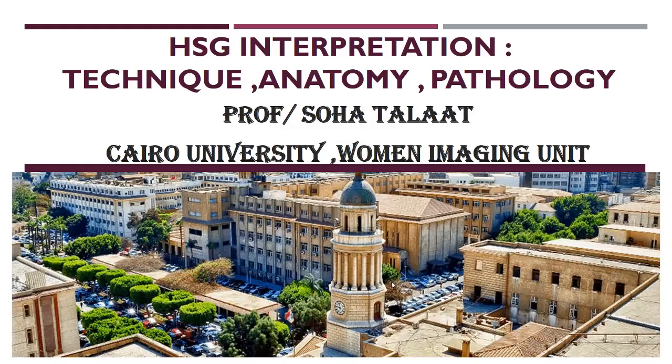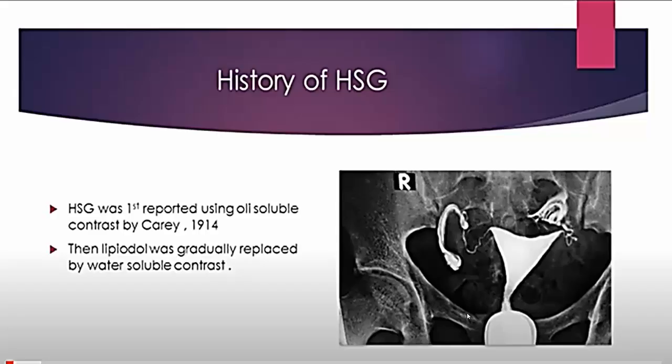Hysterosalpingography interpretation, technique, anatomy and pathology. Hysterosalpingography was first reported using oil-soluble contrast by Carey in 1914. Then Lipiodol was gradually replaced by water-soluble contrast media. This is the oil contrast. It is more dense. You can see here the fallopian tubes. We will see the anatomy later on.